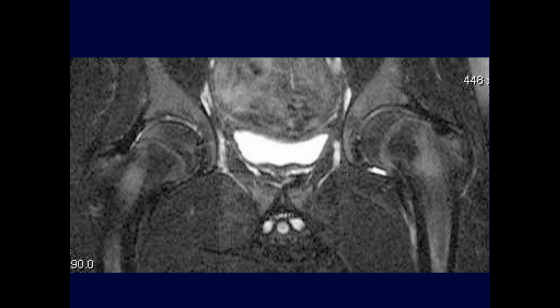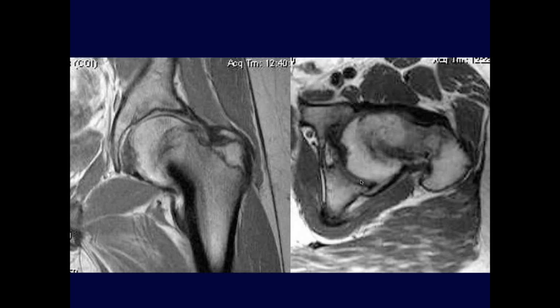Okay, Jennifer, what do you think of this case? So here there is some chronic appearing medial and inferior subluxation of that left femoral head epiphysis. This looks like probably sequela of chronic SCFE. It looks like the physes are closed. And here again, we can see chronic appearing subluxation, and there's some impaction and anterior angulation. Yep. So that's old slipped capital femoral epiphysis.